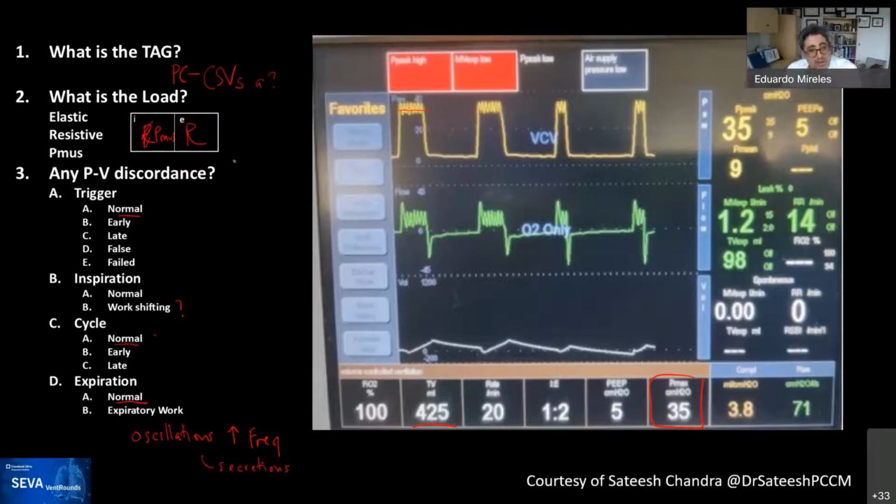And I do agree with you. Possibly be measuring it with a signal like that. Exactly. But I do think that the resistance is elevated. I mean, this makes me think about that. Mm-hmm. But there's no volume being delivered here.